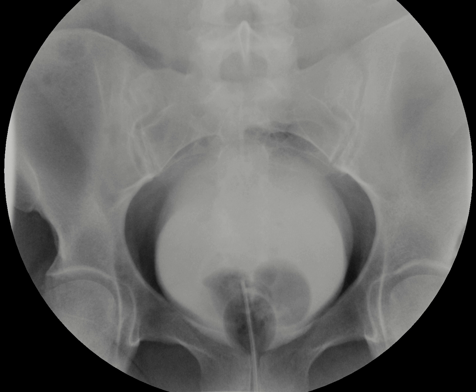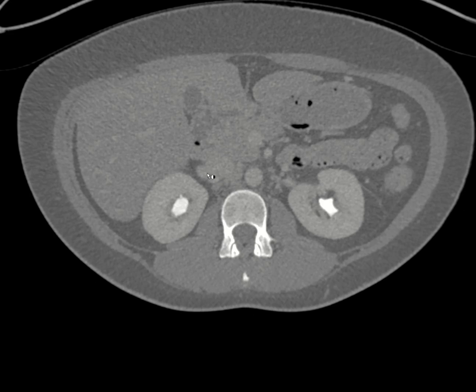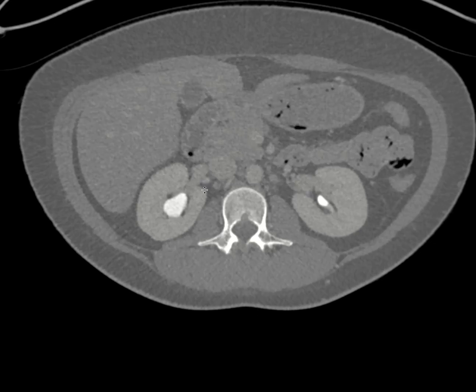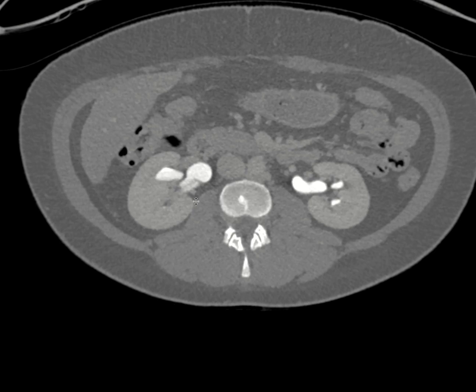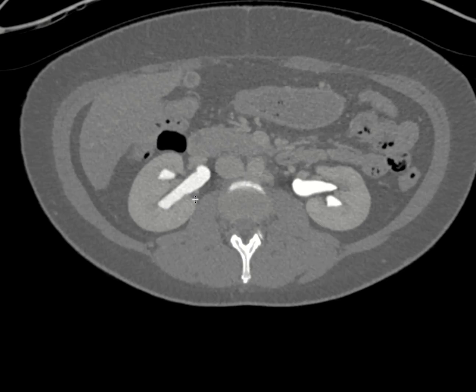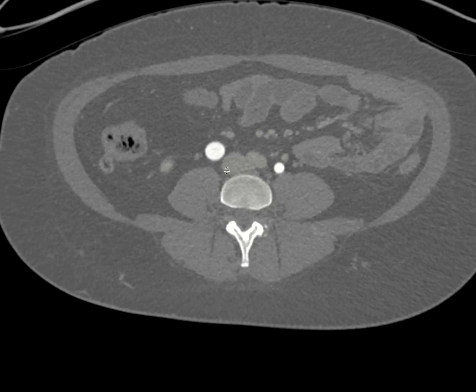This patient also had a CT scan that was performed. Here we can see the CT. It was performed in a urographic phase with a split bolus technique. We can see contrast within the collecting systems bilaterally, and we can see that there's some hydronephrosis on the right greater than on the left, with dilatation of the right ureter greater than the left ureter.